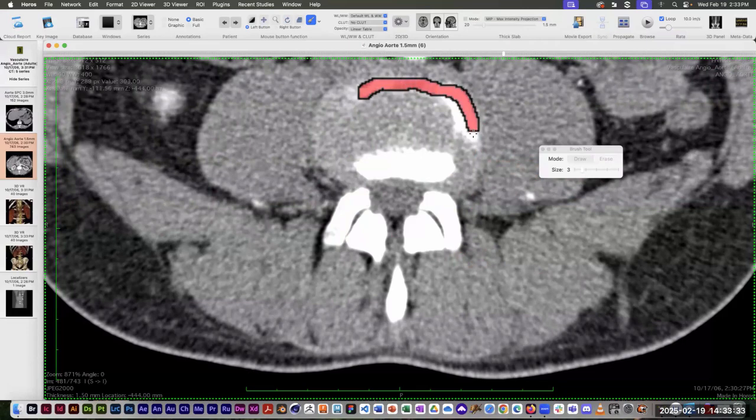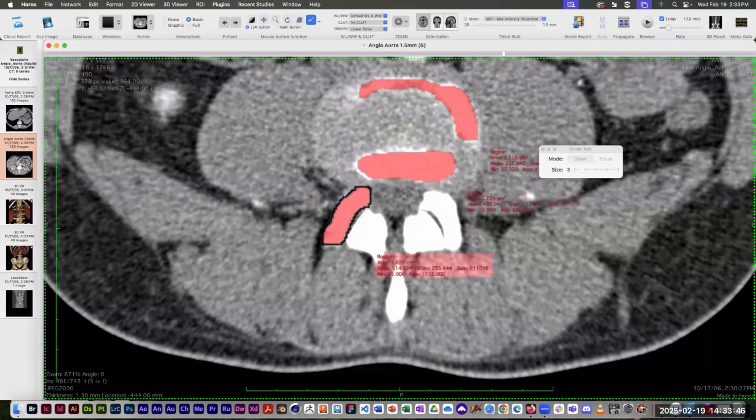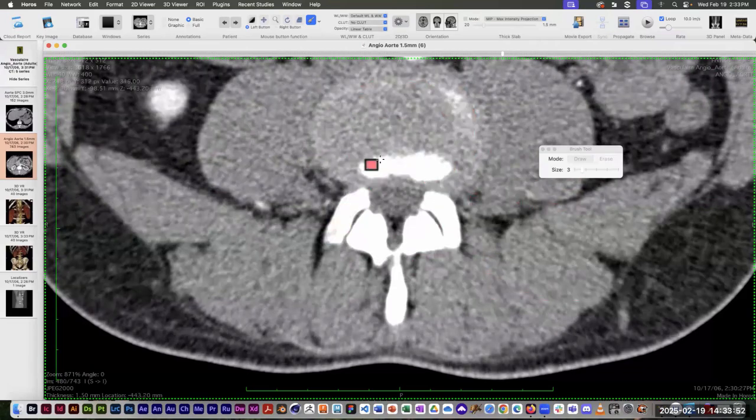So this is the only part of the actual body that's still here. A little bit back here as well. But we still have those facet joints. Going a little bit more, vertebra here, a little bit more of the body. There may be a little up there.